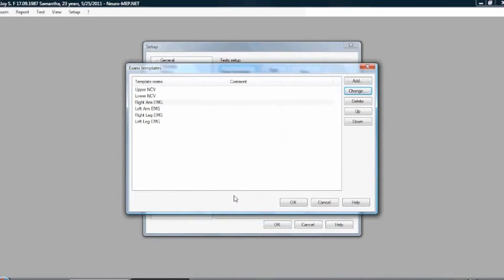Now that we've done this, if you click OK, every time you load these things, when you press test next, test next, test next, it's going to show you these muscles in that order. I'm not going to click OK because I like these setups. So I'm going to click cancel. But if you click OK, it will save it. So in this case, I'm going to click cancel.